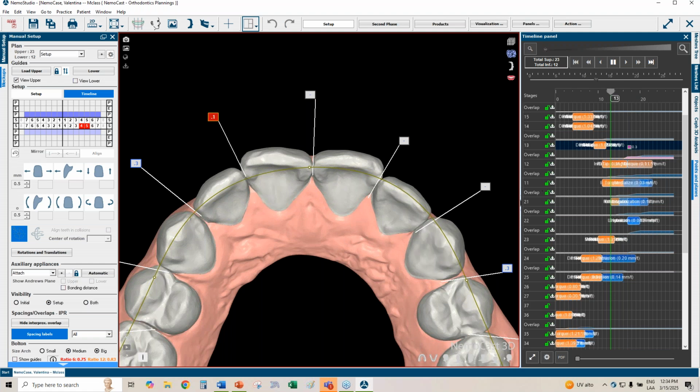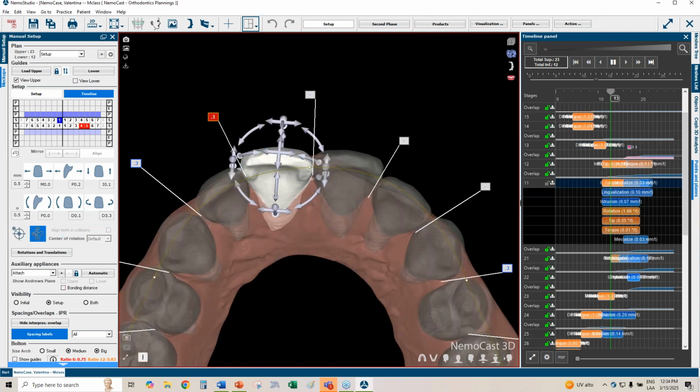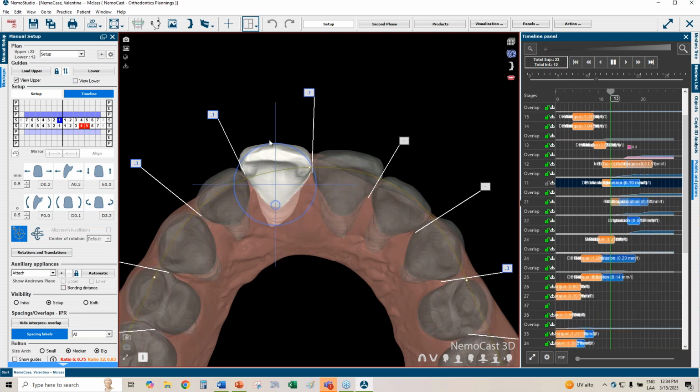okay, so this is important to take note as well. Let's come up with a solution for this. And if we cannot find any other solution other than do a round tripping for this tooth, right? I can actually, mid movement, select the tooth in the timeline and do a little bit of protrusion maybe to get rid of the round tripping, right?